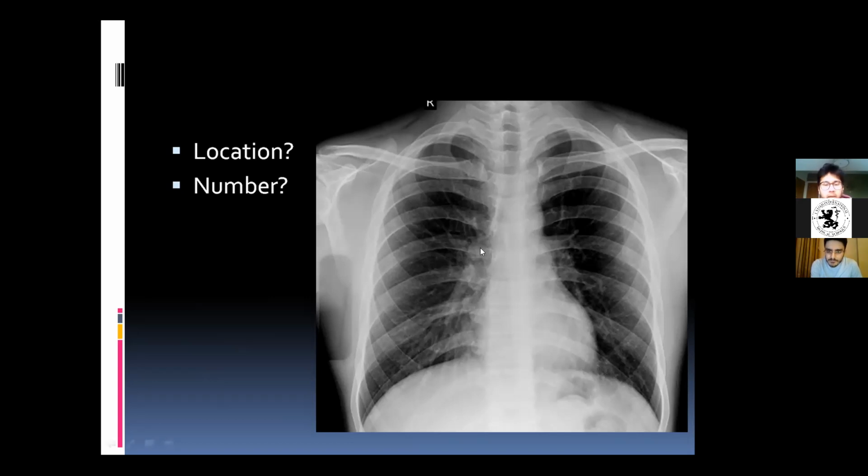Now, in this case, on the right-hand side, I want you to look at the ninth posterior rib. An easy way to show you that is if I get the spotlight out, over here. Okay. To describe this is going to be a little bit hard, but a good way to say it is, number 1, it's an incidental finding. It's a little bit dilated, but we don't really use the term dilated. They use the term callus formation. There's mild sclerosis. There's also something called cortical buckling. Okay, that's what we use, because there's an actual change in the continuity of the bone itself.